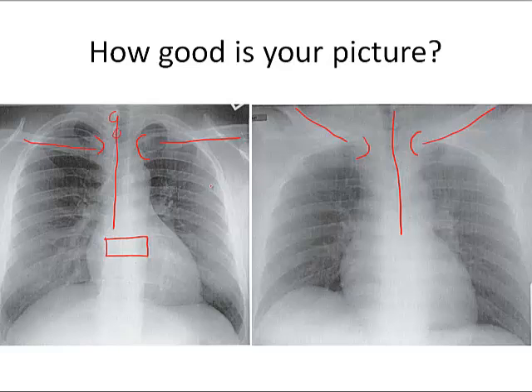And you can see that on both of these, the answer is it's pretty close to right down the middle. There's maybe a little bit of rotation on the film on the left, and maybe a little bit of rotation on the film on the right, in opposite directions, I might add. The last point I'll make is that this is a film of the same exact patient, so you can see how much variation there is depending on the film technique.